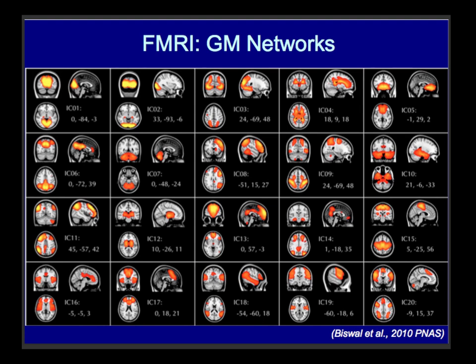What are some other good? I think this is executive control. There's attention. There's sensory motor, somewhere in here, and sensory motor. And so these are on the functional side.